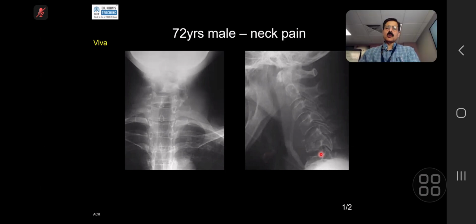Excellent. Well done. So in this particular case, what is happening is that there is a collapse here. You can imagine that there was an intervertebral disc in between, which is gone, all eaten up. The vertebral end plate, inferior and superior, is partly eaten up. There is a bit of localized kyphosis. When the disc space is gone, eaten up, it is taken as a sign of infection. Remember that. I was looking for this finding to be pointed out, which the candidate did well.